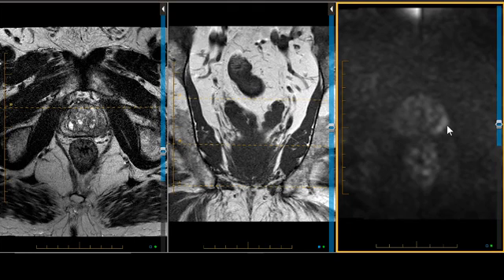And then, as we said, any cytotoxic or necrotic edema can diffusion restrict, and this can rarely occur in the prostate gland. Now, some other critical causes of failure to diffusion restrict. Well, one is low-grade tumor, Gleason 5 or 6. The B-value, as we said, not high enough. Got to have that B-value 1,200 or more. And another one, perhaps the reason why this B-value did not, at 1,000, show the tumor as well: one, the B-value wasn't high enough, and two, there's air in the rectum. So air in the rectum may inhibit your ability to get a nice, crisp diffusion restriction.